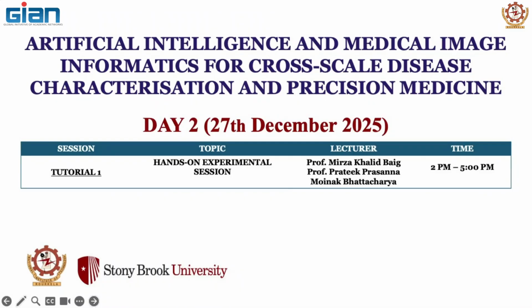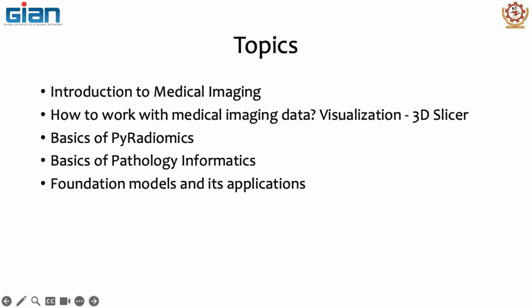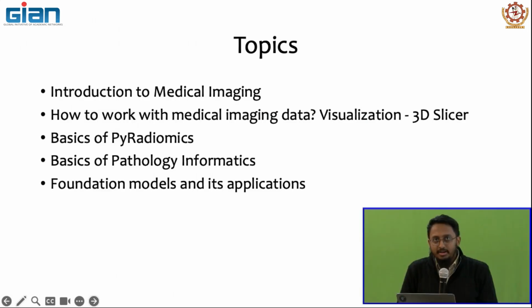So, today's hands-on experimental session has been prepared in collaboration with Professor Prasanna and his team. In this hands-on session, we will start from medical imaging 101, an introduction to medical imaging. Then we'll move on to how to handle medical imaging data. For this, there is a software which you will all get to use. You will see how this software works in action, 3D Slicer.